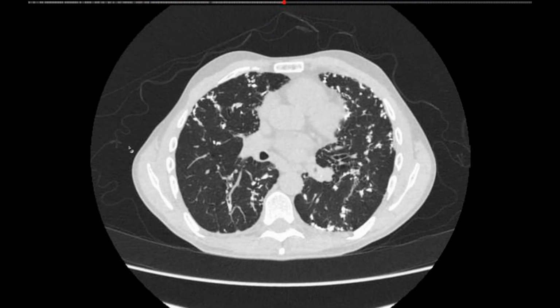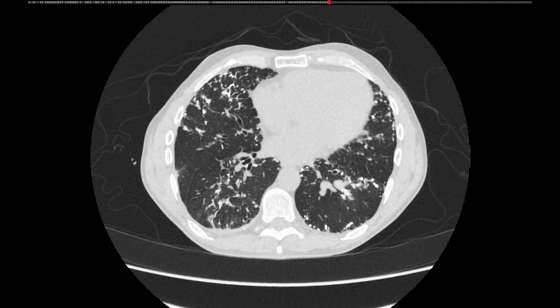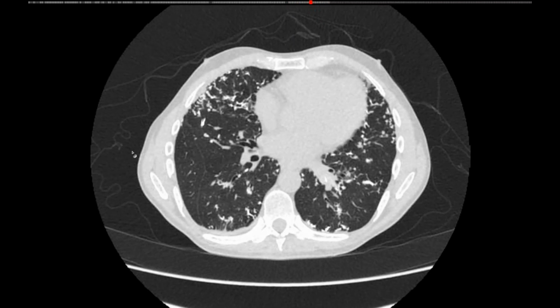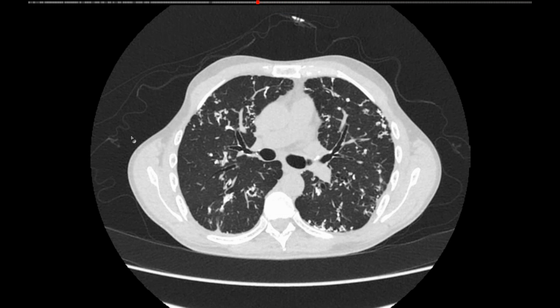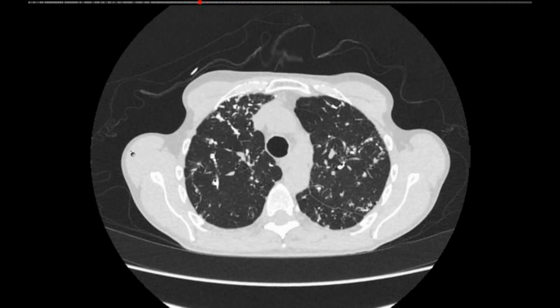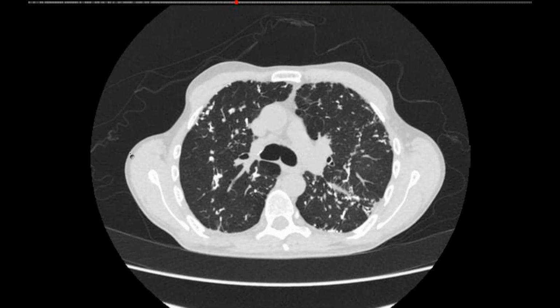So we've certainly seen that before. And usually I reassure people that this is in effect harmless. It's in this case probably idiopathic. It's not a diffuse fibrosing disorder in this patient that should be associated with symptoms necessarily. And it's a disturbing but otherwise easily explained imaging phenomenon. And this is one of the nicest ones I've seen as well of this entity.